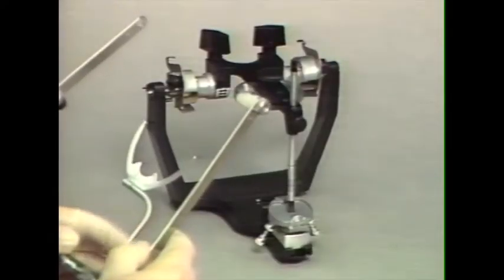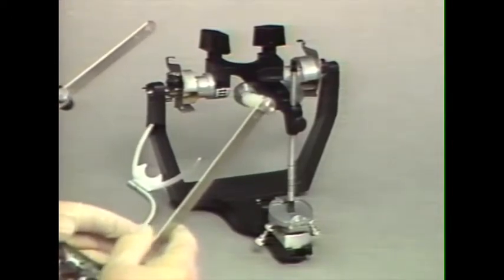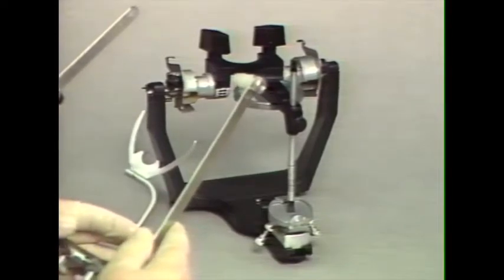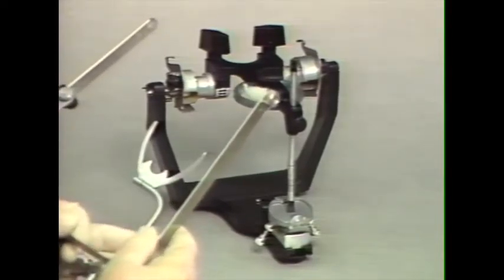The facebow record can be transferred to the articulator by one of two methods. One is by the direct transfer, where the facebow itself is used. The second is with the mounting platform, where an indirect mounting is used.